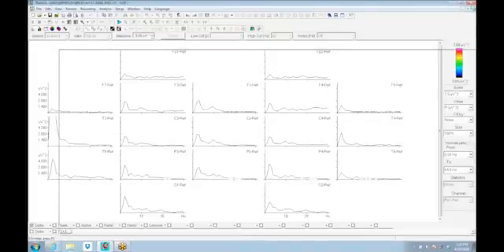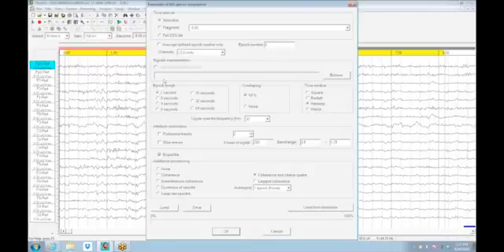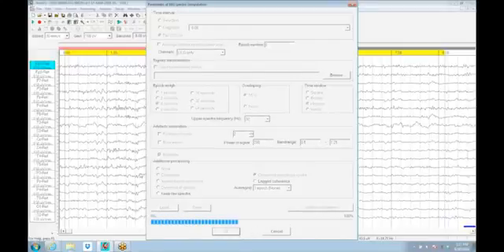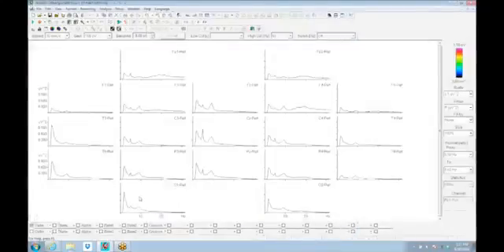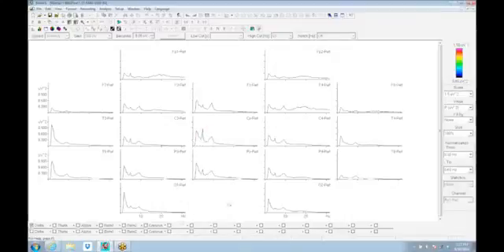And as such, it's my preference, if I have the ability, to use a database that has a larger epoch size. And with the database here, you'll now see we have a very narrow frequency peak here at 4.8 hertz. It ranges from about 4 to about 6, but it's a very narrow little peak, and that was missing with the 1 hertz resolution.